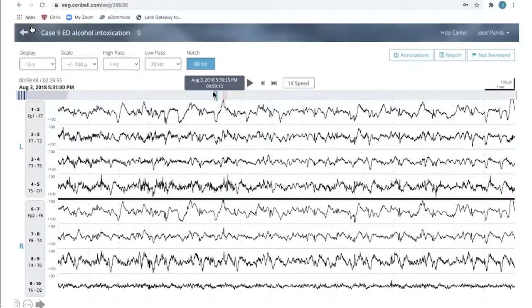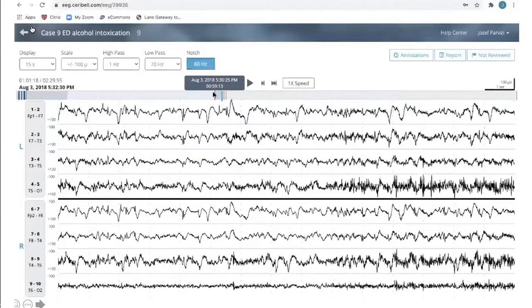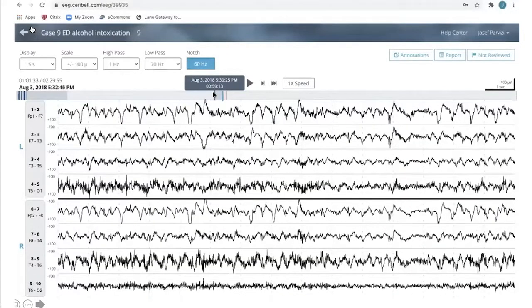They occur sometimes, looks like 3 times within a second. It seems rarely that it's more than a second without. And so overall, they're recurring pretty quickly. Right.